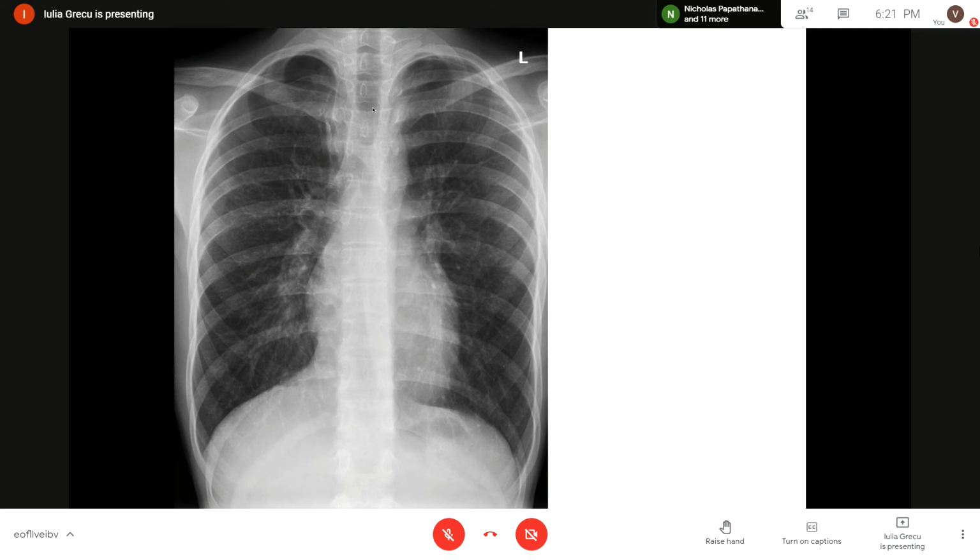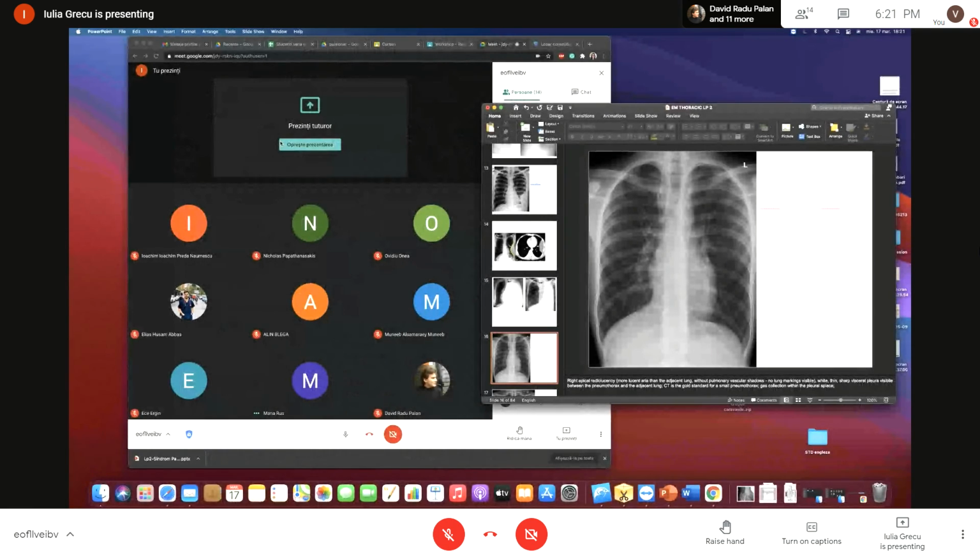Okay, if someone sees, please intervene. It's like, I don't know, little white lines, little white marks. There are white marks in the lung that represent vessels and interstitium, pulmonary interstitium. Another thing, someone else. Come on.